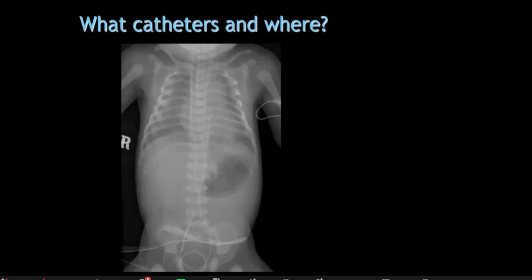While the umbilical artery catheter, I can see both umbilical artery catheters and UVC are in malposition.